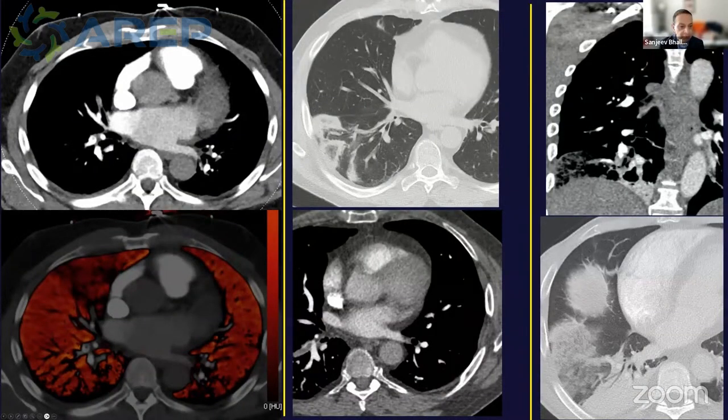We look on our parenchymal windows for infarcts, and if you're doing dual energy, you may see some decreased areas of iodine. We don't tend to use this very often. We find that it's very useful just to look at the gray images. But I do want to share with you this pattern here. This pattern, a peripheral airspace opacity, is very typical of an infarct. Notice there's even some bubbly ground glass. I think many of us would say this looks very similar to a reversed halo that we can see with organizing pneumonia in another situation. But when the rind is thick like this, don't forget about pulmonary emboli.